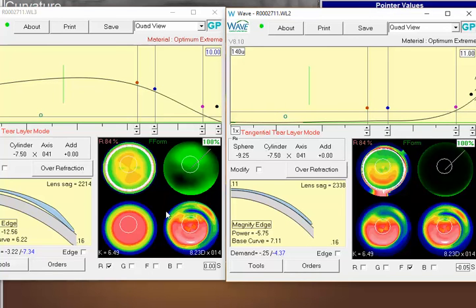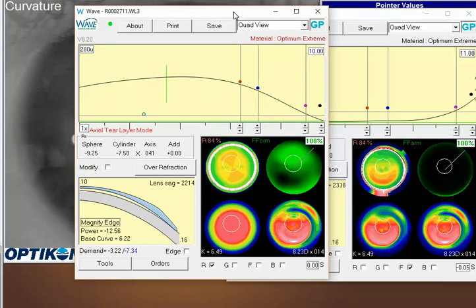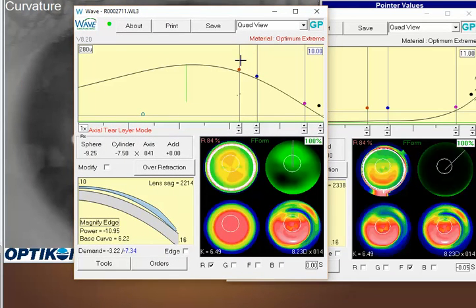These cases are very challenging because you don't really have true data that you're working with in the periphery. So quite often you just have to use your best judgment. One more comment: if you do want to stay in the RSIM design, basically what you can do is flatten this lens out a little bit.